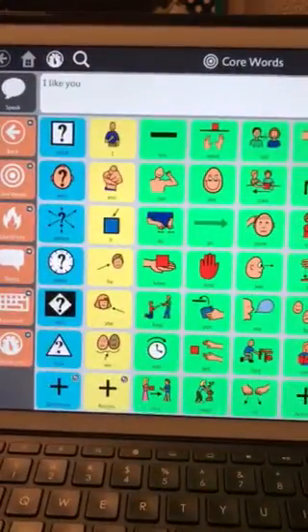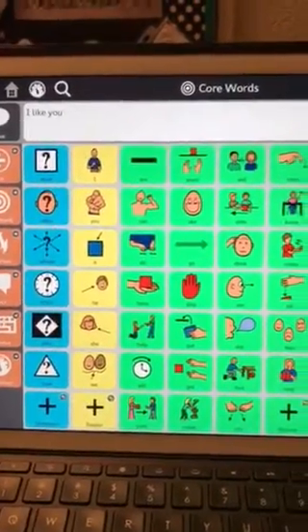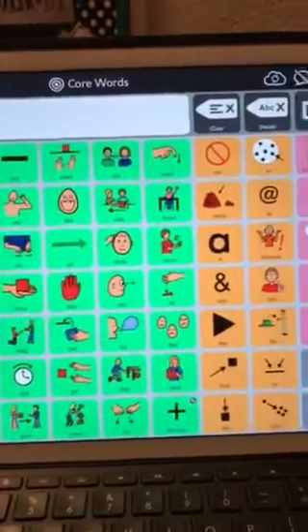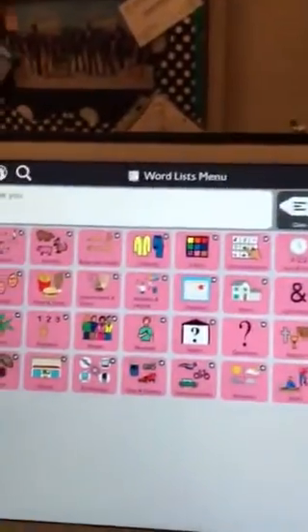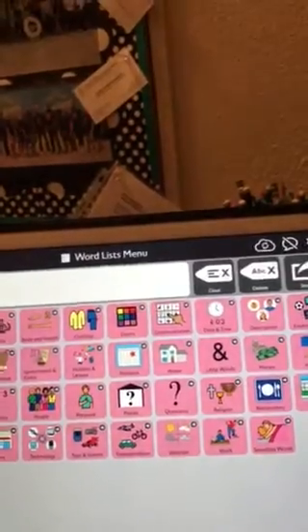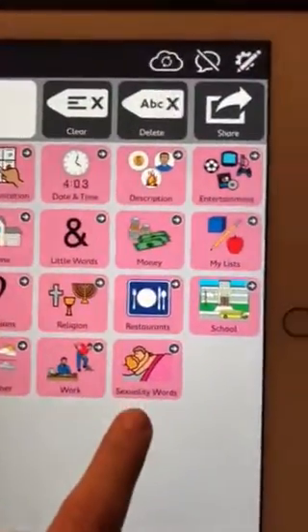The one thing that there is some limitations to is you'll notice that here on this grid, we only have really common words such as what, who, where, when, why, how, make it a question, talk about people, you are, want, need. So are really common things. You can go ahead and find some extra things over in here. So you have an all word list. So here you'll find things like actions, animals, body, health, clothing, colors, time, date, holidays, home, religion, school, sports, and stores.